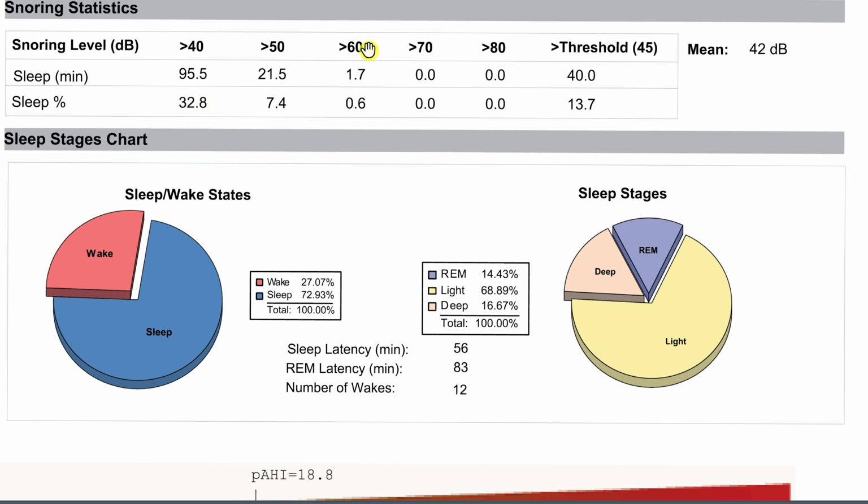And you can go over here and go, okay, well, what about above 60 decibels? Oh, it was only 1.7 minutes, which isn't even 1% of sleep time. The mean is about 42 decibels.